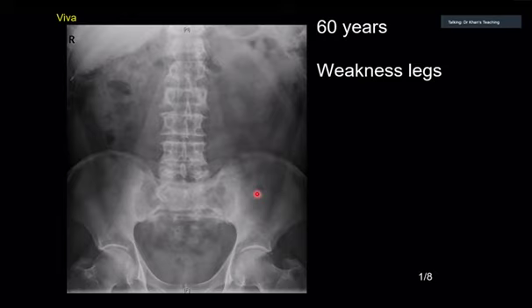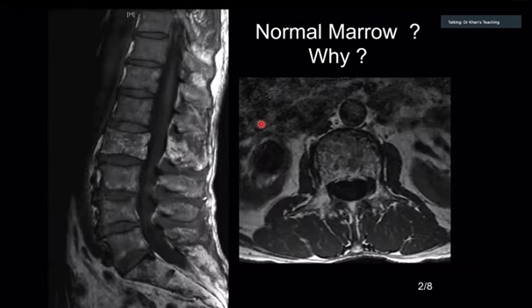A bit of a stretch of imagination. Well, maybe it's the other way, because I'm looking at one and comparing it to the one next door. So maybe L4 is bigger. Right. Okay. Oh, and actually the right pedicle of L4 in particular. I think that's L4. Okay, so if this is L5, 4, okay, well then 3, yeah, I'm looking at 3, 2. Okay, so we'll come back to this.